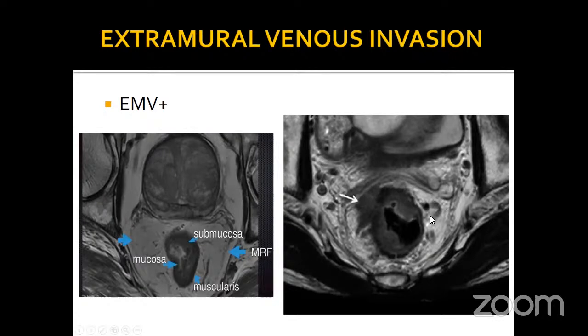This is a high risk group tumor. You might get EMVI within the mesorectal fascia. You might get EMVI outside the mesorectal fascia. So the importance is similar. You might get tumor deposit within the MRF. You might get tumor deposit outside the MRF. So here is a bulky tumor. Anteriorly, between 2 o'clock to 6 o'clock, there is extramural invasion up to the mesorectal fascia. There is a node outside the mesorectal fascia and extramural venous invasion outside the fascia.